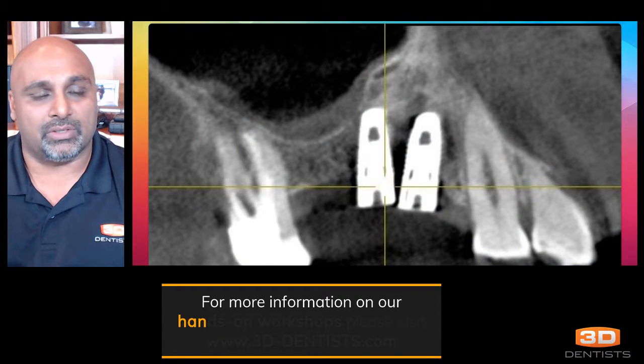Today, I really want to focus on doing some implant planning. So again, if you can ask some questions along the way, that would be good. Or if there's anything in particular you'd like to see, if I could bring it up, I would do that for you as well. So let's go ahead and move over to the slide deck here.